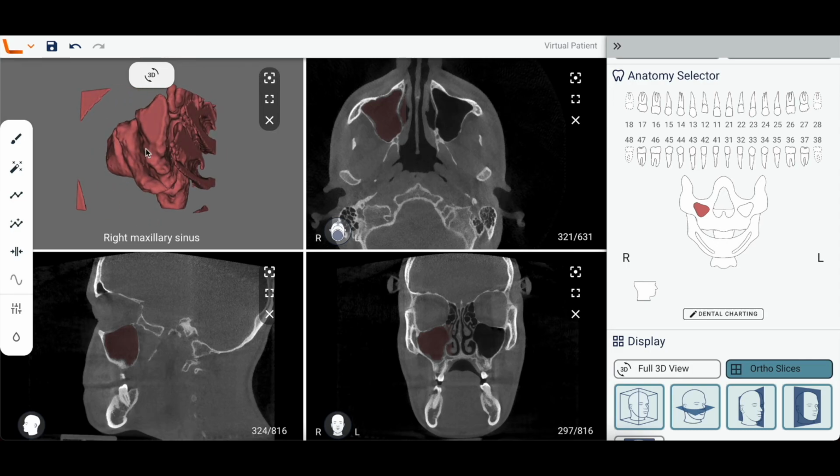As you can see, by thresholding, we've also included some small parts outside of the actual patient. We recommend to simply remove those using some of the other tools like the contour tool or the livewire tool.